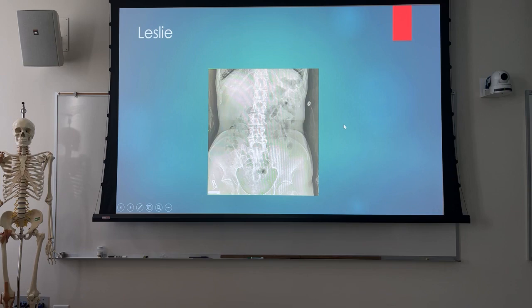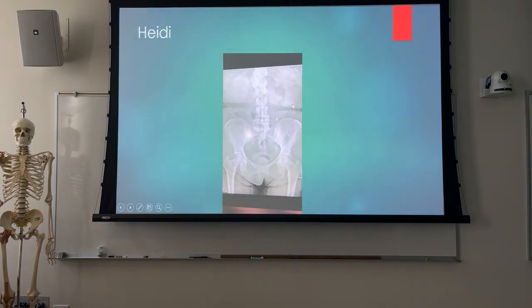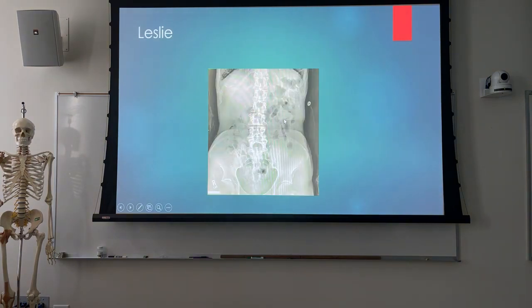So this is not Leslie, but this is the image she gave us. Again, we kind of have an appearance in this case of possibly some ascites. We've got some loss of contrast, loss of bone mineralization. Do you remember anything specific about it? No, I think they were just looking for kidney stones. Kidney stones, okay. We've got a kidney stone one coming up. Well, that looks like a kidney stone right there. Heidi? Yeah, there's a kidney stone. So, you know, that's starting it.